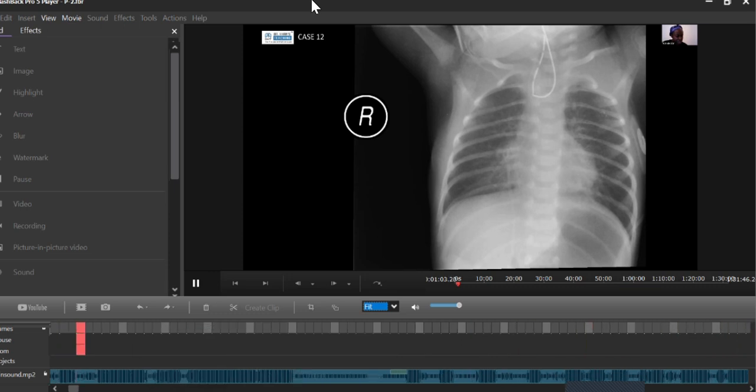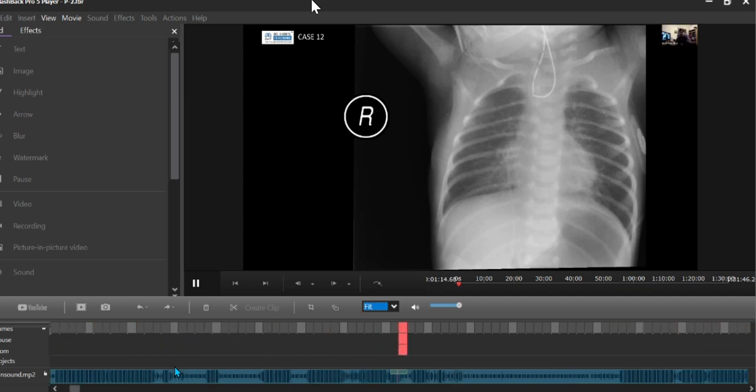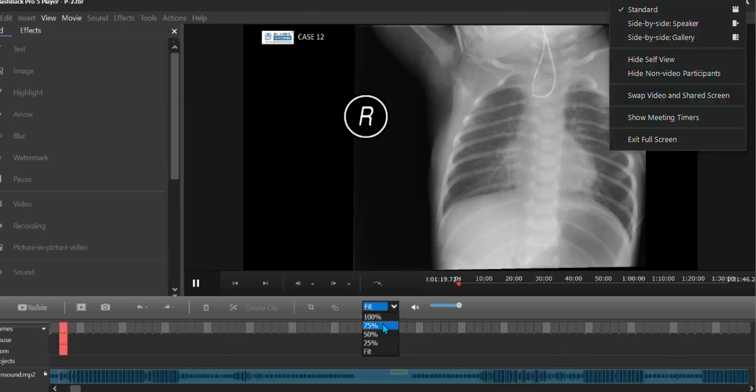Okay. So sorry, I was saying that this is actually the sticker for an ECG lead here. So this is just an ECG lead rather than a vascular line. And then you can see there's a similar appearance on the left chest wall. And then this is the NG tube as described, coiled in the proximal esophagus in keeping with esophageal atresia. What else about this radiograph? What's the other feature on this radiograph related to the esophageal atresia, candidate 3?